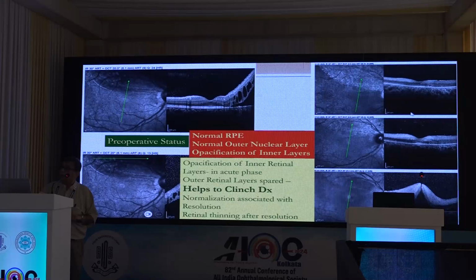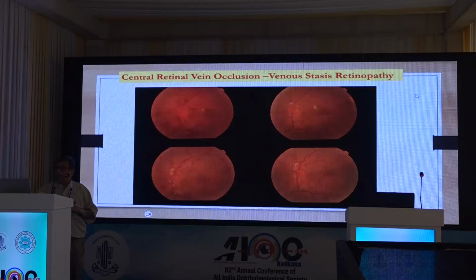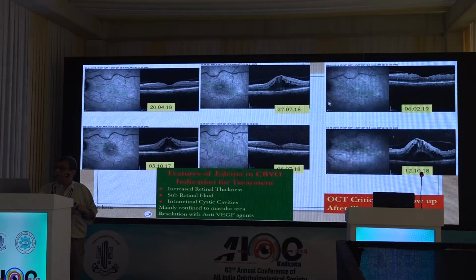And then with time, this will go away and the retina will become thinned out. This is the less scary thing, a CRVO, still scary but not as scary. You can see these multiple hemorrhages, and if you look carefully, you see this macular edema, neurosensory detachment, and then you treat this patient, becomes all right.